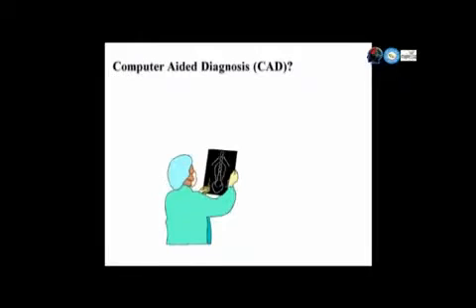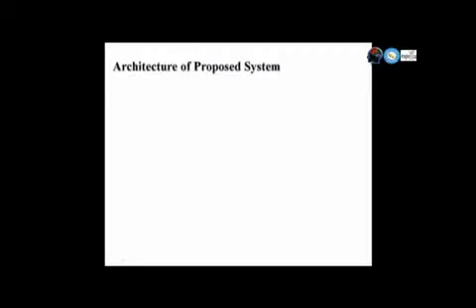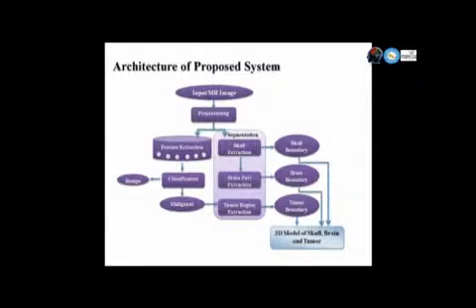The problem has been lingering in the field of medical science for years. There are different computer-aided solutions that use the technique of digital image processing, providing three-dimensional view of an image, but Brain Inspector is the first solution which lets the radiologist embark on a paradigm where they can have an opinion of the solution itself. The system's opinion is based on clear classification, segmentation, and three-dimensional visualization of the brain. The technique to implement the solution is innovative in all dimensions.